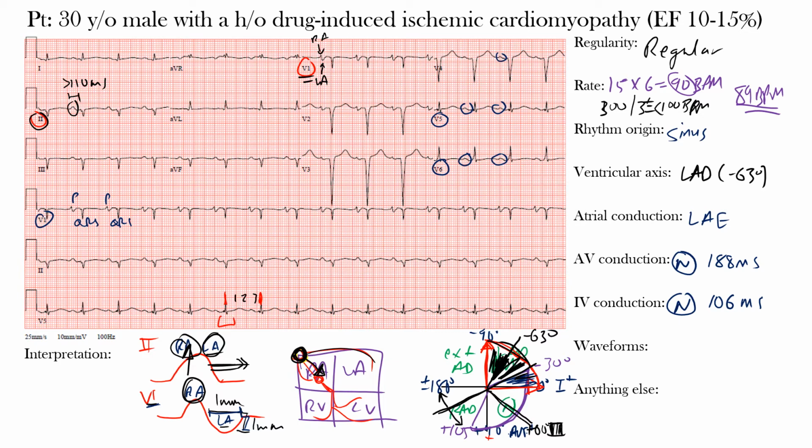We can certainly see evidence of abnormal Q waves in leads V1 through V4, and this suggests evidence of an anteroseptal infarction. And remember, the EKG is dynamic during the infarction process, or ischemia, okay? And pathological Q waves tend to occur about 6 to 16 hours following the onset of ischemic symptoms.